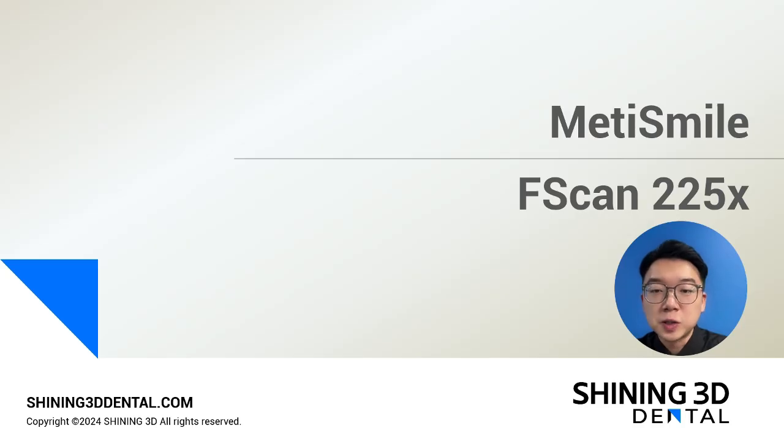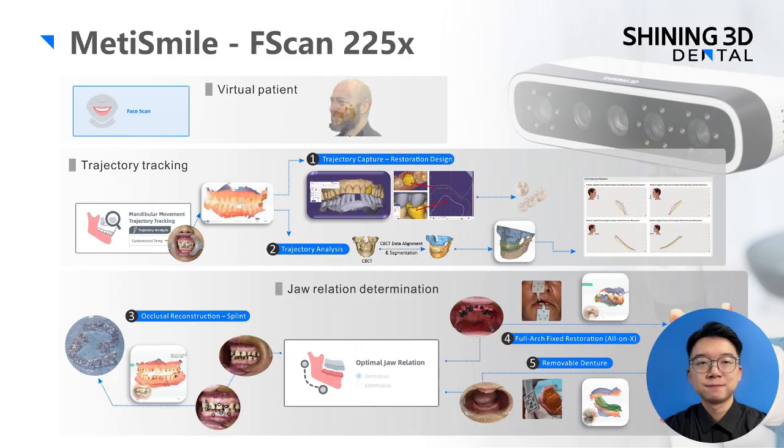Today's webinar will focus on the MetiSmile FScan 2.2.5.4. It's a software update, but the major update will be in the jaw motion module. That will be our focus of today's webinar. Without further ado, let's dive right in.